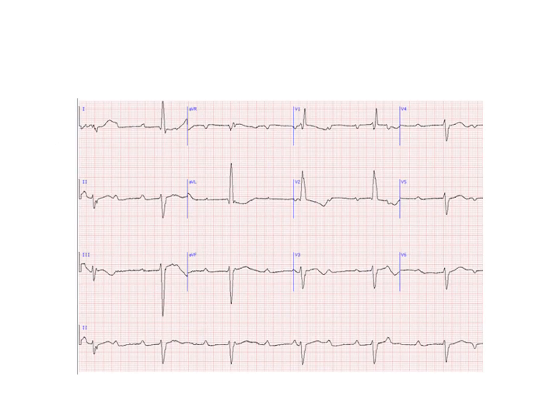And finally, the granddaddy of them all, the third degree AV block. Now, what characterizes the AV block is the slow heart rate, usually between 20 to 40, the lack of relationship between the P's and the QRS's, and finally, the widening of the QRS. Why? Because this is a ventricular escape beat. As we mentioned, there are three levels of automaticity in the heart.